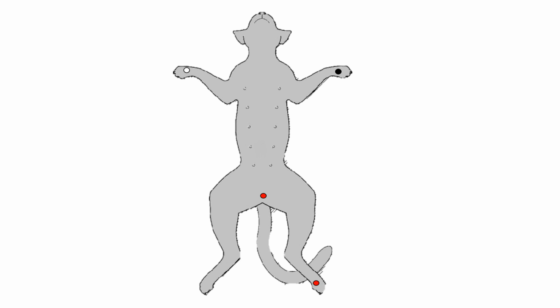The first one runs between the right forelimb and left forelimb, with the left forelimb electrode acting as the positive electrode. The second one runs between the right forelimb and the left hind limb, with the left hind limb electrode acting as the positive electrode. The third standard lead runs between the left forelimb and left hind limb, with the left hind limb electrode acting as the positive electrode. The three standard leads collectively form what is known as Einthoven's triangle.